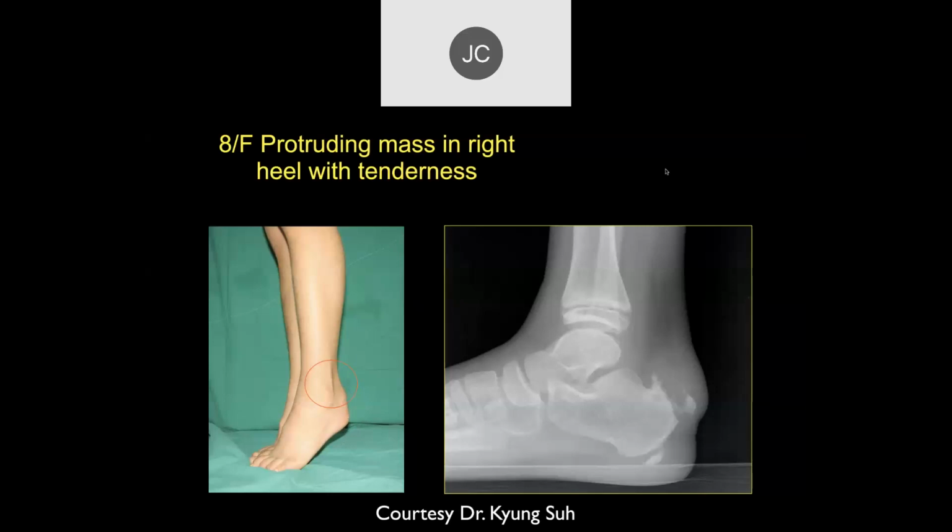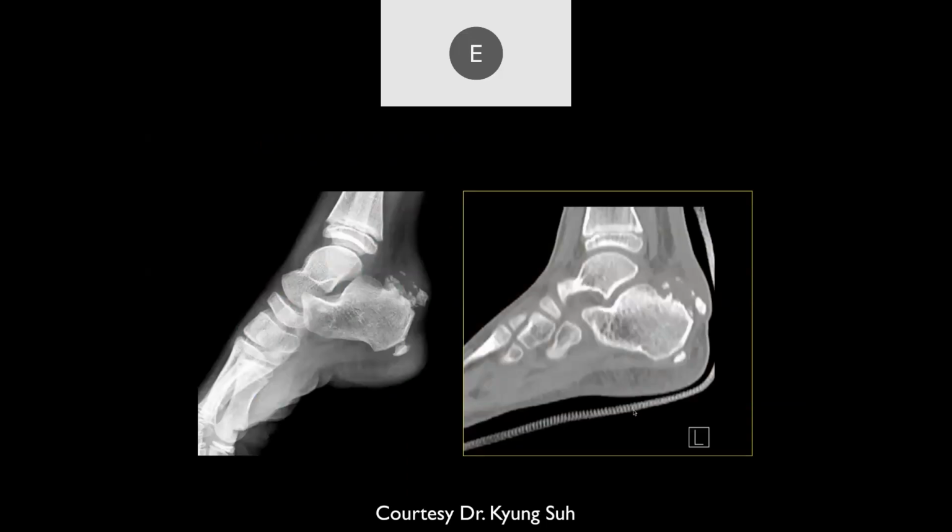Elior, what do you think about this patient, 8-year-old? It looks like the apophysis is retracted proximally there. And there's the bone protuberance, not a Haglund deformity, but just this pointed structure there.